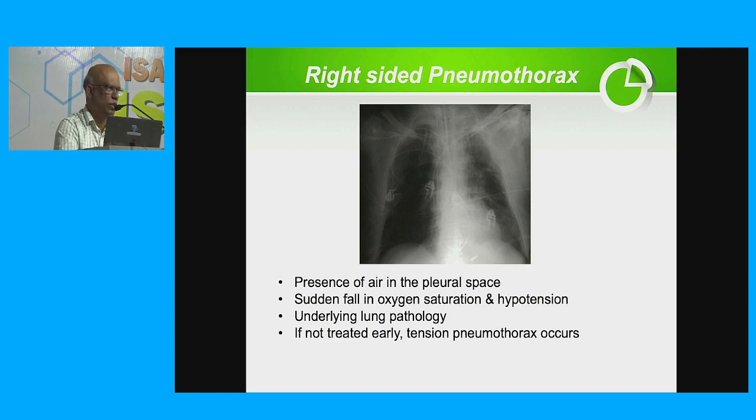Or your slip of tongue may stimulate the examiner to ask from a different angle. Suppose you say it's a normal X-ray, something like that. Also, a film that is not properly positioned can mimic these sorts of pictures. So before interpreting as pneumothorax, always make sure that lung shadows are seen on the opposite side, the mediastinal shift is there, there are no lung markings, and vascular markings are absent. All these should be checked.